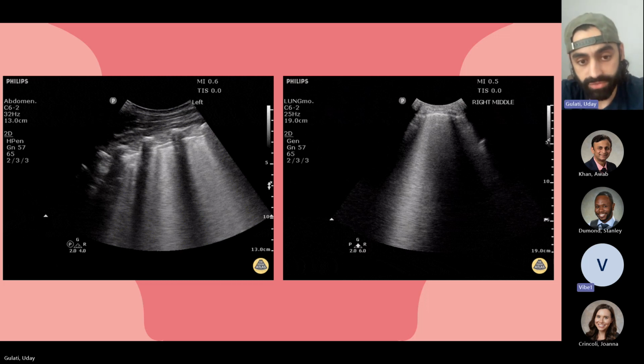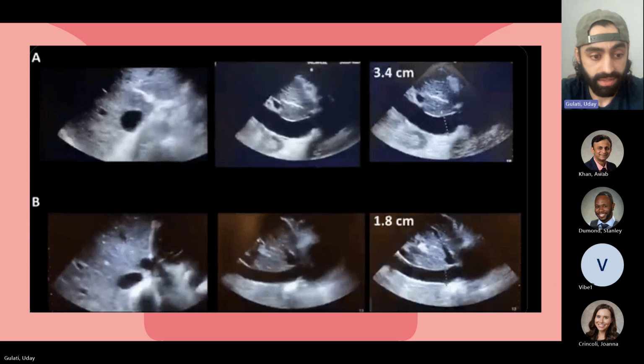If you remember from the lung ultrasound lecture, there's only one thing that the presence of B lines tells you. Does anyone remember what that is? Because it's not that there's fluid in the lungs. The answer is that there's no pneumothorax. That's the only thing B lines tell you. So knowing that, it might not be the most reliable marker of not to give more fluids. Regardless, in someone like this, seeing this lung ultrasound, I'm likely very hesitant to give fluids.